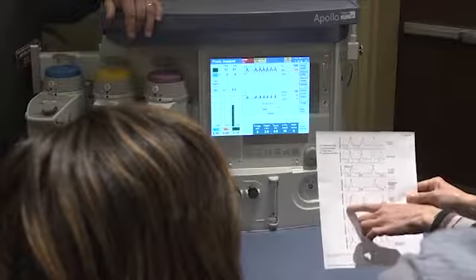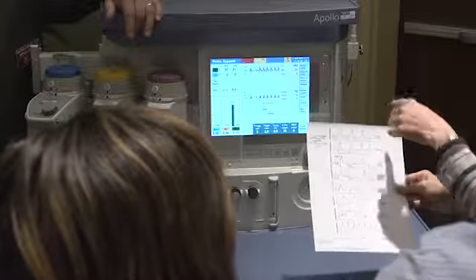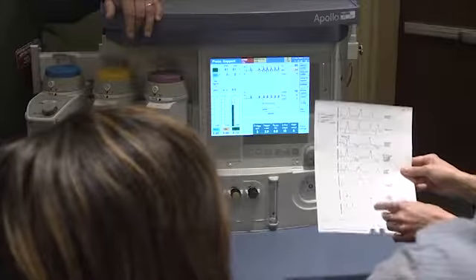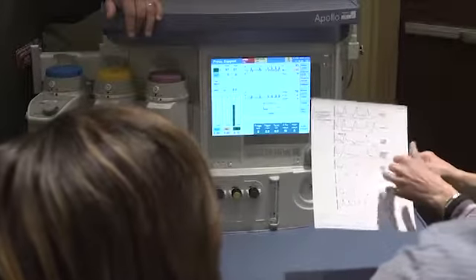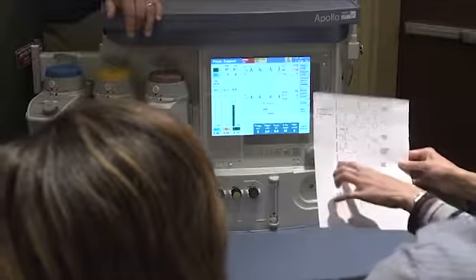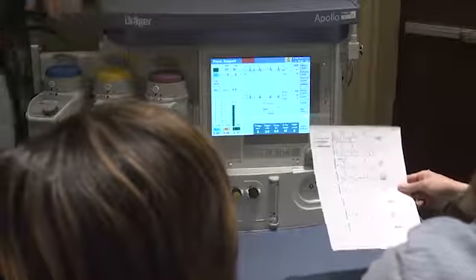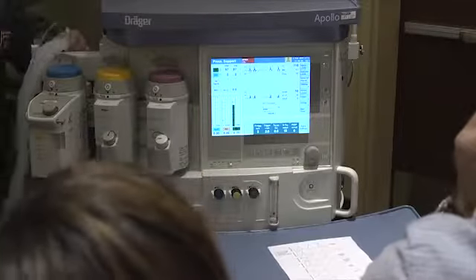In the pressure support mode, it's followed by additional delivered tidal volume depending on how many centimeters of water you have. That's the difference between control modes of ventilation and modes where the patient would initiate the breath. You would have the dip here, and then you will be able to differentiate between these modes of ventilation, either volume or pressure control.